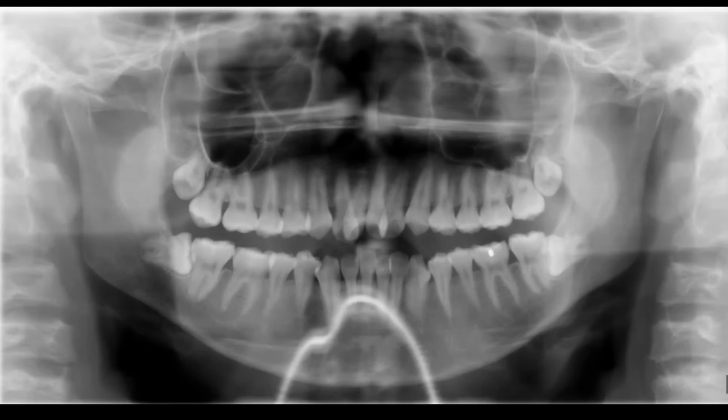The metal necklace has created an image over the mandibular anterior teeth, making this a non-diagnostic radiograph for the mandibular anterior area. This metal necklace should have been removed. At the same time, see the tongue position error again with the dark band at the apical area of the maxilla. So do you remember from our literature review that tongue position error happens in 70 to 80% of the cases? A proper instruction to the patient to swallow and hold will help in eliminating the tongue position error.